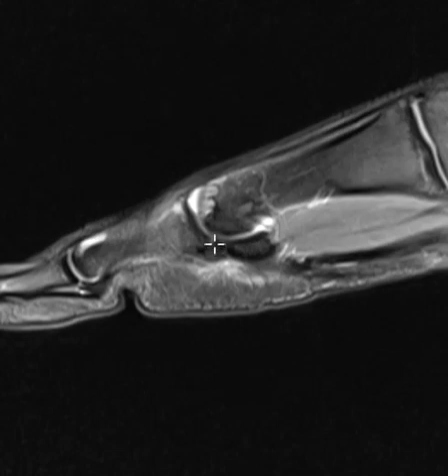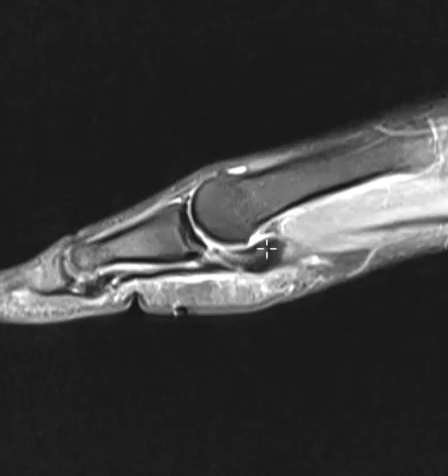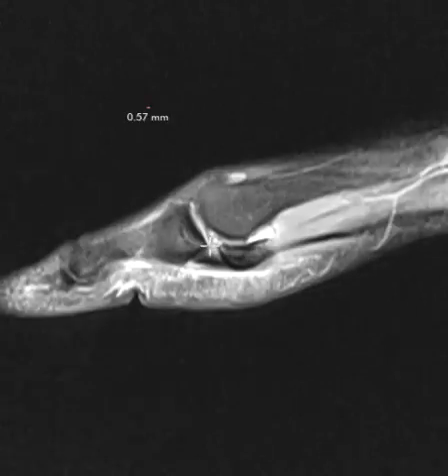Now if we go off to the lateral sesamoid bone, we're going to look for that sesamoid phalangeal ligament. We see this dark glob here. This is that ligament. It looks totally intact. There may be a little tiny cleft right here, which is normal, but there's no big gap. There's no retraction. If we go off to the other side, we see that it looks like there may be starting to become a little bit of a gap, and we have this defect that's too large, but there is an intact ligament here, and this is not drifted backwards.